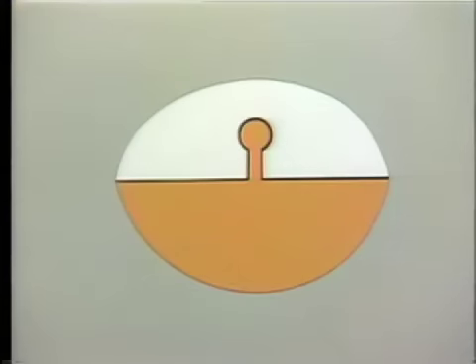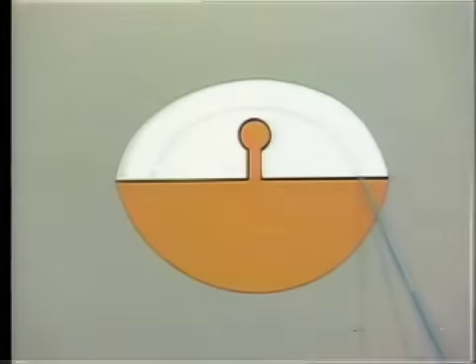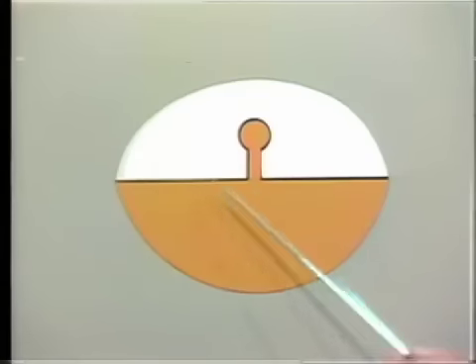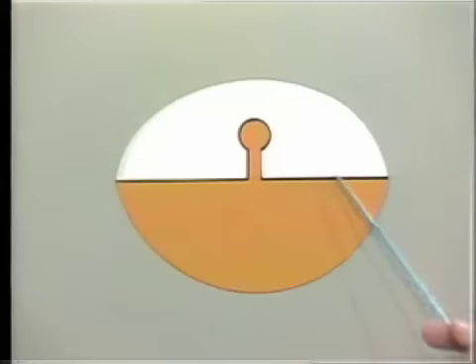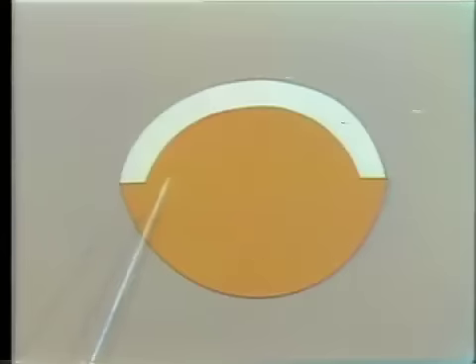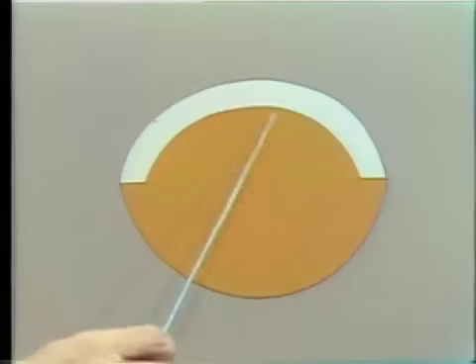In order to avoid this, it's customary to modify this aspect of the pontic by hollow grinding this part of the porcelain around here in the fabrication of the porcelain. This is hollow ground just around in here where the dotted line indicates. The result of this is that when the backing here is waxed up, wax is carried forward to that line there and covers over this area here, and after it's been cast, this of course appears in gold, so that this fitting surface of the pontic now has a gold apron extending forward here.